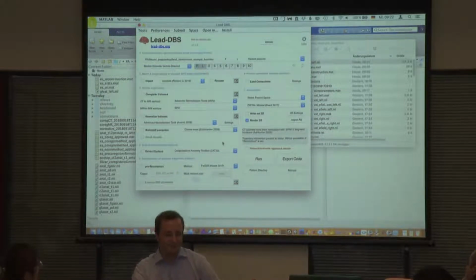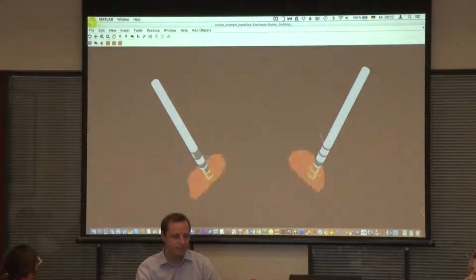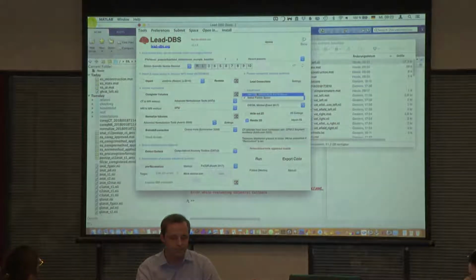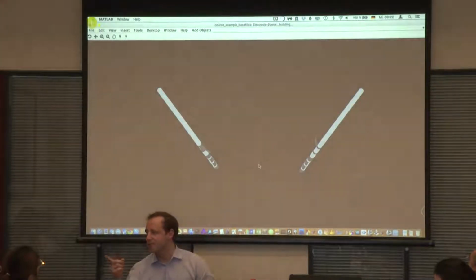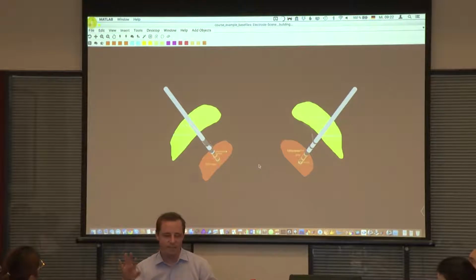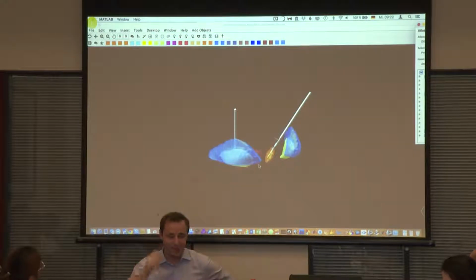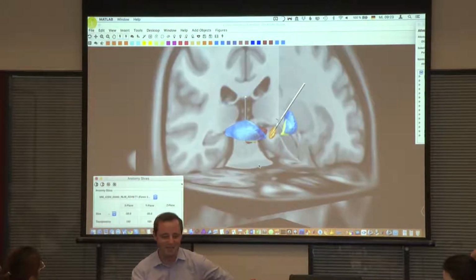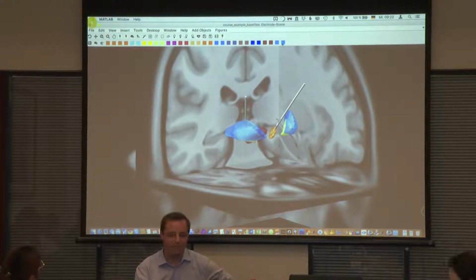Okay, great. Then maybe I can also quickly show you the microelectrode recording tool, because I know you were a bit interested in it at least. One thing about it is that I haven't programmed it, so I only know the basics. Sorry about that. But I can show you at least where to open it and how to look at it.